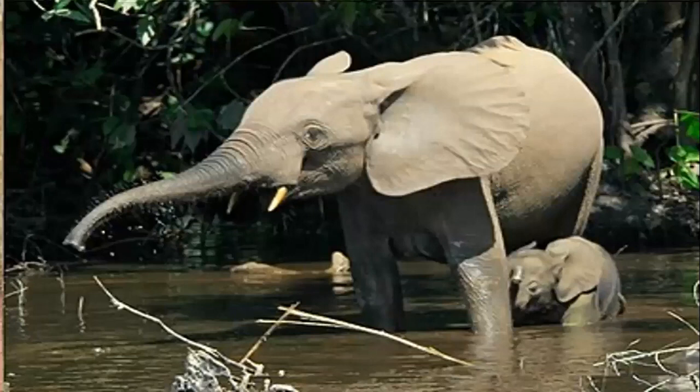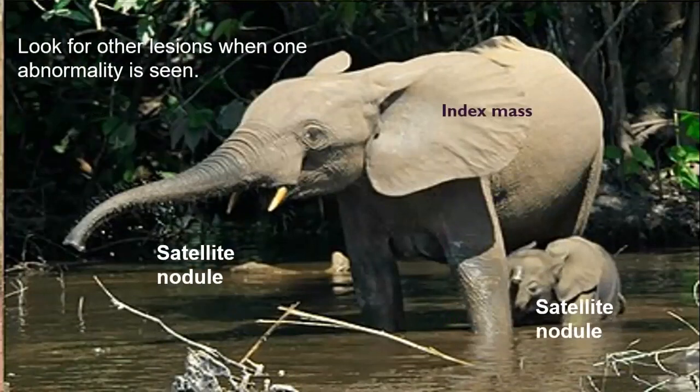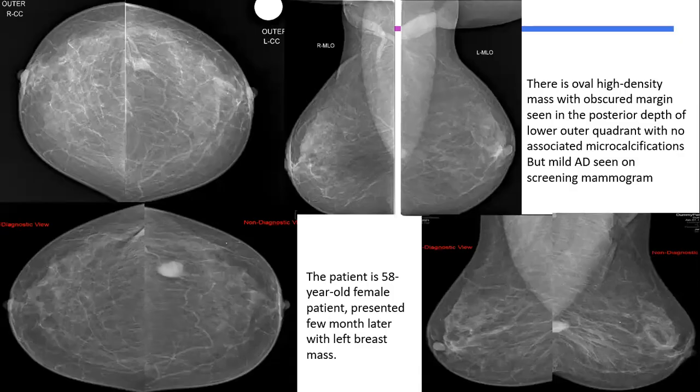So the message here is, if you have seen an elephant, look for a similar smaller elephant. If you have seen an elephant on mammography or any imaging, look for a smaller one in its vicinity. This is like an index mass and the satellite nodules. And this lady also had a missed breast cancer.